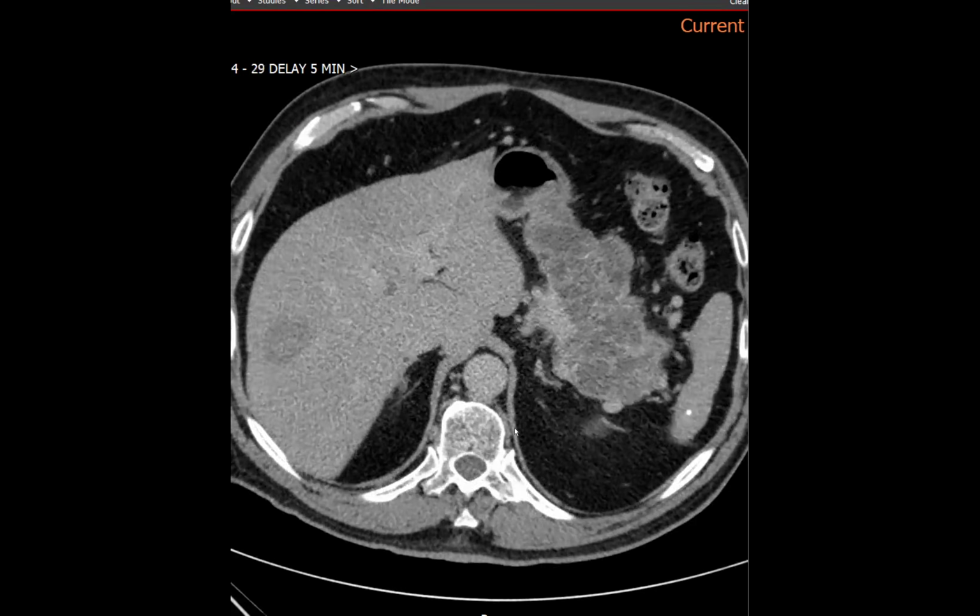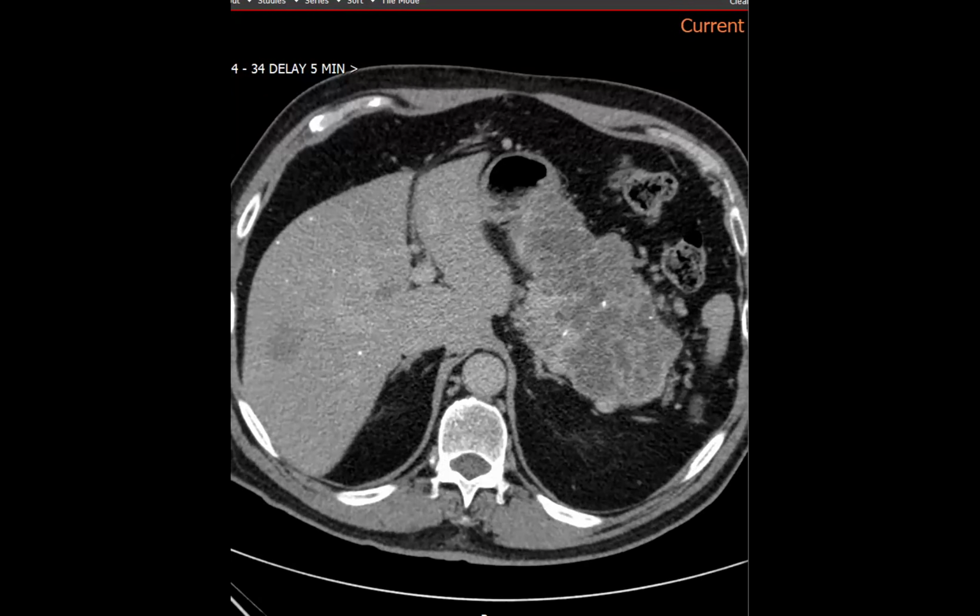especially on CT, they can often look solid and kind of ugly, but it's because they have so much vascular septae. Do we have MR? No MR. I wonder if there are areas that are solid and restricting diffusion and just look bad.